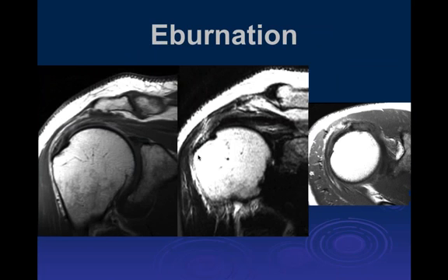The other thing that you can get that is associated with increased risk is eburnation. Notice that this acromion is neither downsloping nor much of an osteophyte. What we have is a very irregular inferior surface, but this is indicative of trauma irritating the bone in this location, and this also has increased risk. This kind of trauma may have been from prior injury, but this irregularity of the inferior surface is also thought to increase the risk of irritation of the underlying supraspinatus tendon and producing impingement.